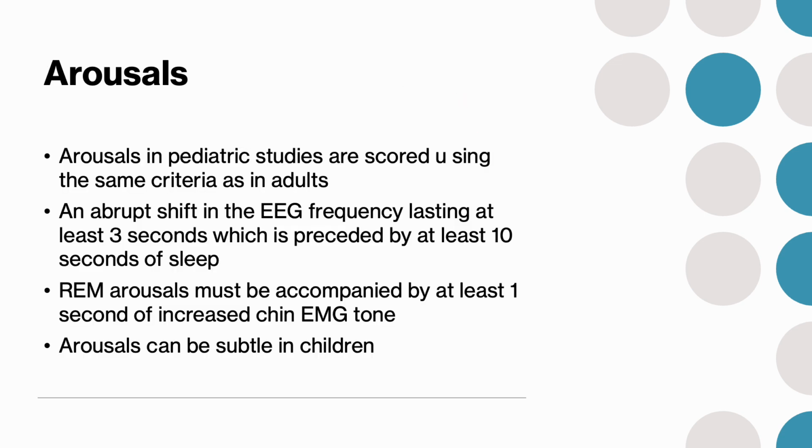Although we score arousals and not stage arousals, I 1 billion percent suggest that you score arousals as you stage sleep in the 30-second window. You already have to determine when arousals happen when you stage to figure out what stage the epoch is based on where the arousal is, so you might as well put it there. It's popular with technologists to score arousals in a 2 minute window. But the problem is you get into the habit of putting an arousal next to every hypopnea or apnea, even if there is no alpha present. You can't really see it there.